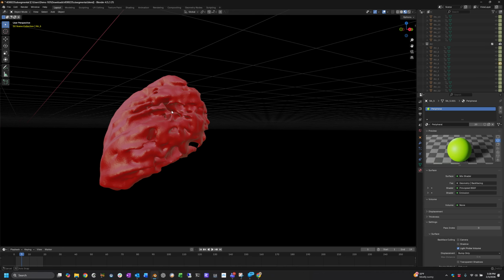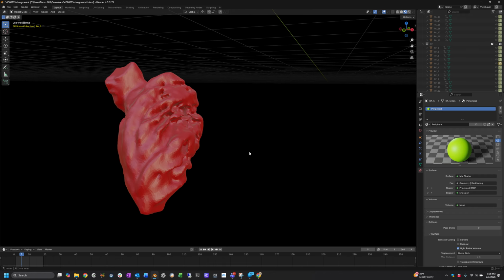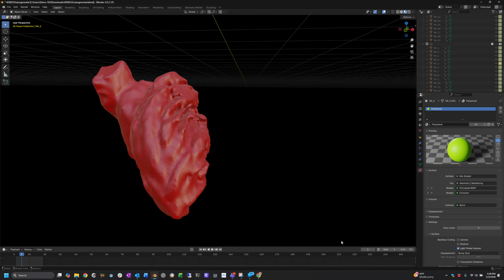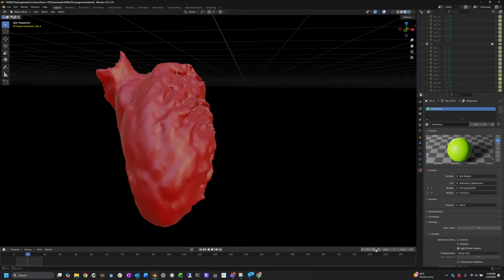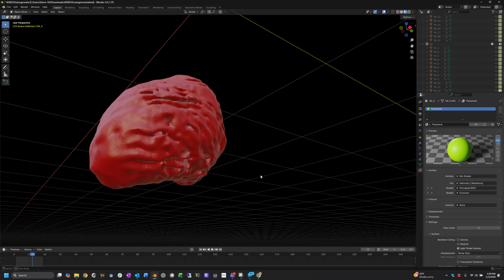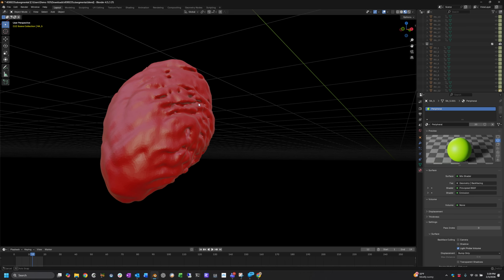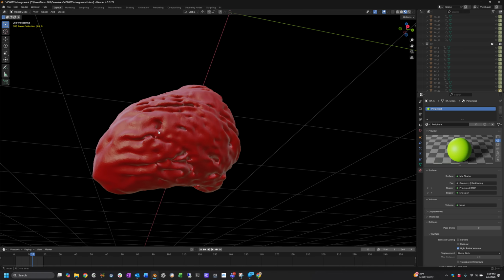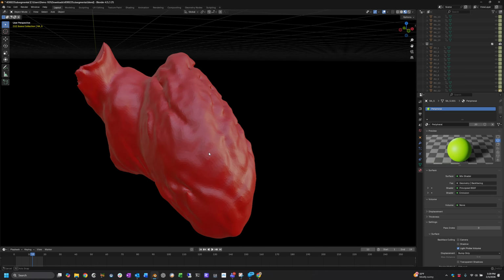this is a papillary muscle cavity, as is this, and those exist in all of these cases, and I would hope those would be preserved. As we go through, if we go out to end diastole, I can still see the papillaries, you can still see how there's a gap that runs up in there. So those are the trabeculations. I'm hopeful that those will be preserved in this analysis.